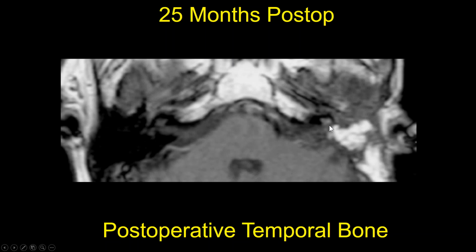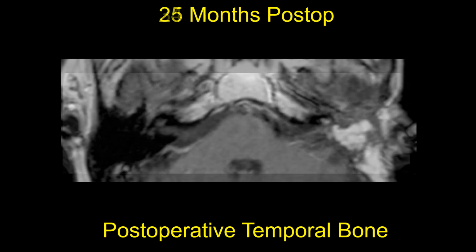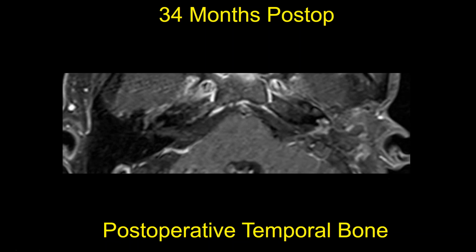Here's another postoperative case where we see abnormal enhancement within the cochlea itself, and all the fat packing from this translabyrinthine approach. This similarly was mistakenly called residual or recurrent tumor, but this is simply labyrinthitis ossificans with abnormal enhancement, and that enhancement may persist for a long time after the surgery itself. So we want to be careful about calling normal postoperative changes versus recurrent or residual disease.